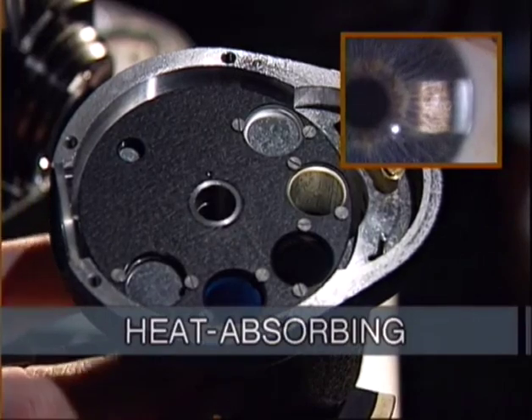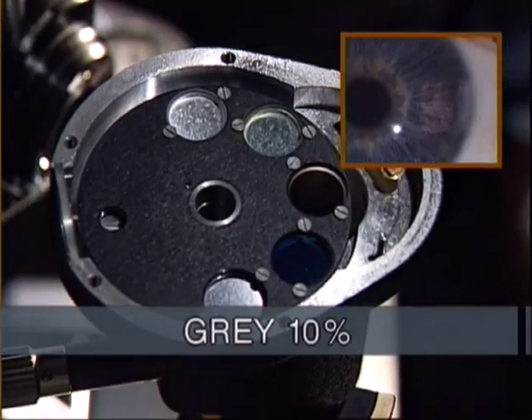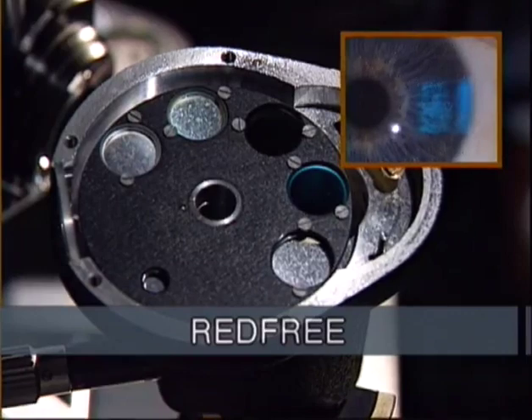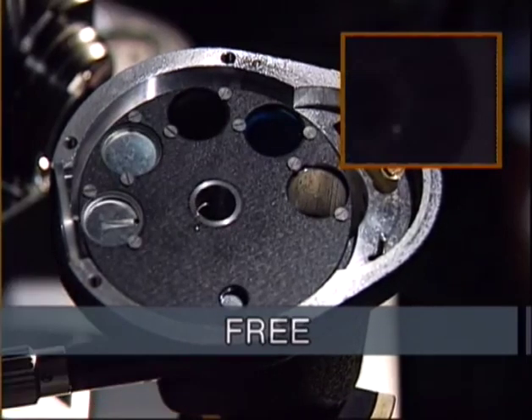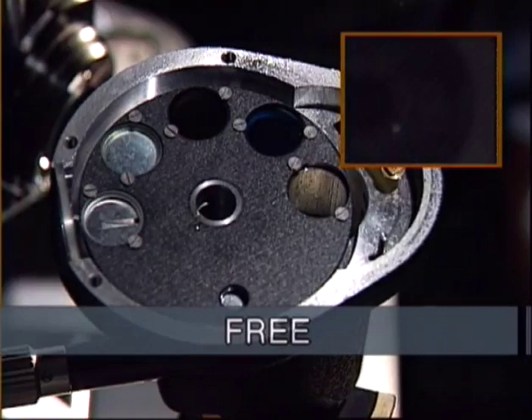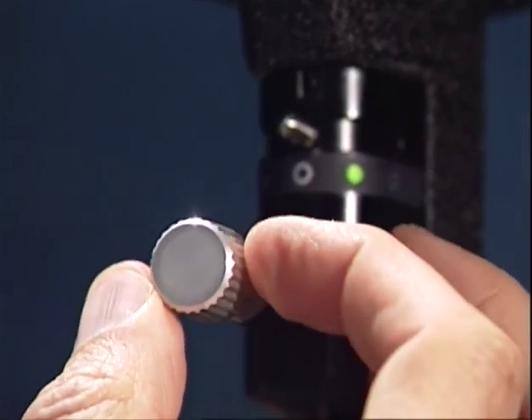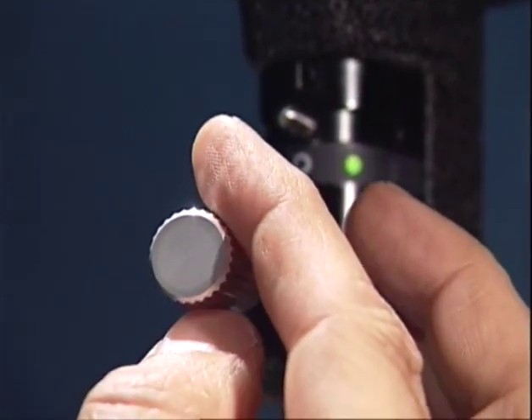Another filter reduces the brightness of the light beam. This filter is used for examination in red free light. And here is an empty position for filters to be added according to special requests. This control knob changes the diameter of the light and interposes 2 additional filters.